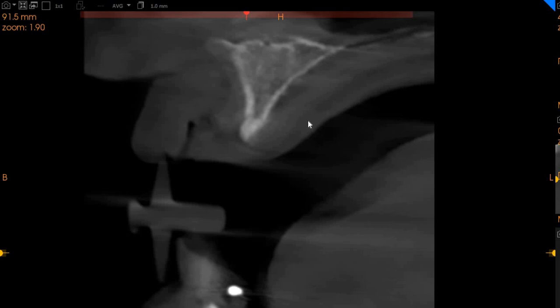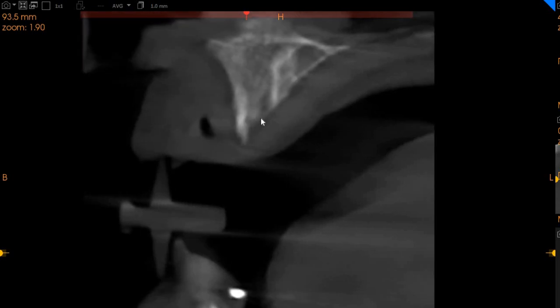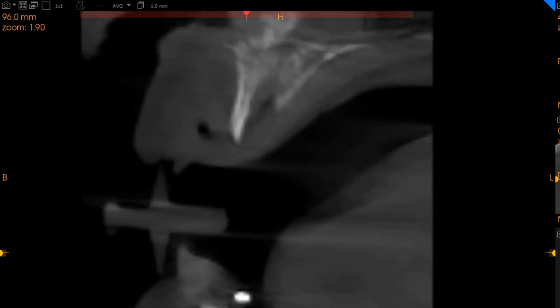This is the upper left anterior region. Here we do have some bone, 3.6 millimeters of width with 11 millimeters of height. So the upper left quadrant, central incisor region, we do have some bone. Upper left quadrant, lateral incisor region, again we have not very good bone, but 2.5 millimeters of width with approximately 10.5 of length.